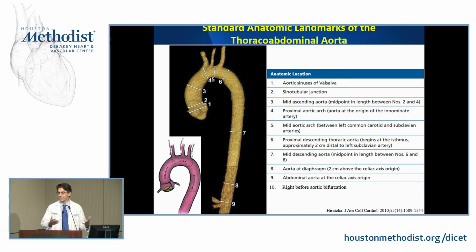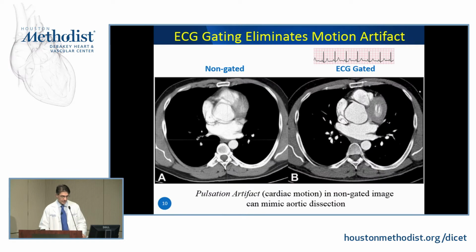Pretty much, if you've sat with us in CT or CMR, we are reporting these exact same measurements on all our reports. And it becomes very important because, when this patient comes back for evaluation, whether this aneurysm or enlargement is getting bigger, it's so important to be able to compare it to the old report, to the old study on direct analysis, and then to be able to make measurements in exactly the same places.